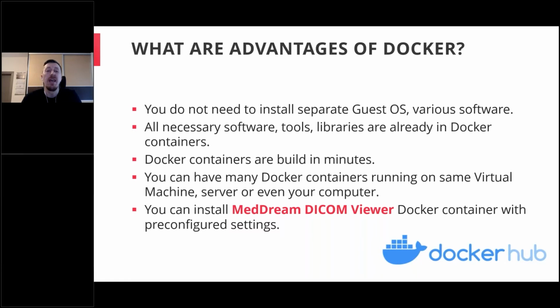And also you can have as many Docker containers running on your computer, on your server, or on a virtual machine, as in my case I will show you. So there are no limits. For example, for testing MedDream plus DCM4CHEE, you would install basically 4 or 5 different containers on the same virtual machine, and it would work without problems. Also, as mentioned, you can install the MedDream Viewer container with pre-configured settings. I will discuss this configuration and the pre-configured settings later, and I will show you when we deploy the Docker container.